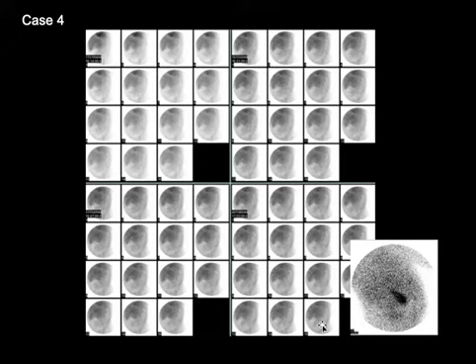So in this situation, the intervention that we have as an option is to acquire delayed images, and we did a 24-hour delayed image, and we are looking at, on this lower right corner, a right lateral view of the abdomen at the end of 24 hours showing activity in the gallbladder, ruling out acute cholecystitis or cystic duct obstruction. So remember, when the hepatocellular function is impaired, liver may not excrete any tracer, and the only option we have is to give liver some more time to process the tracer, and maybe the delayed images will show some small bowel activity or like we see here, gallbladder activity.